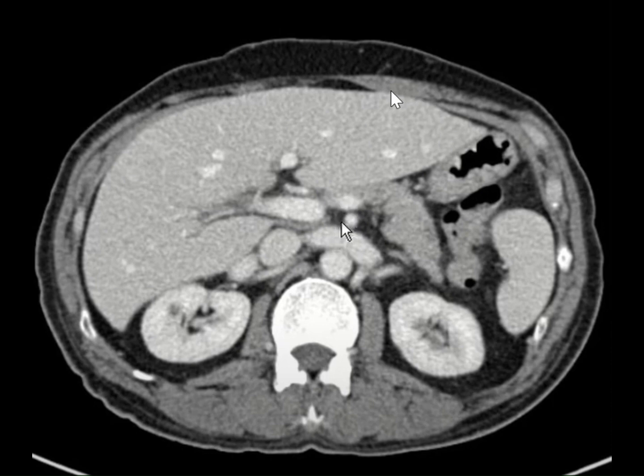So I will start with 3, and I will use the hepatic veins. So this is 3, 4B, 5, and 6. The 6th hepatic segment is close to the kidney, the right kidney.